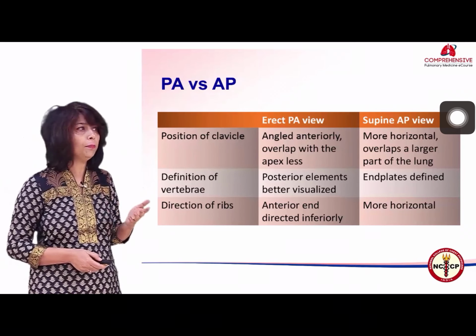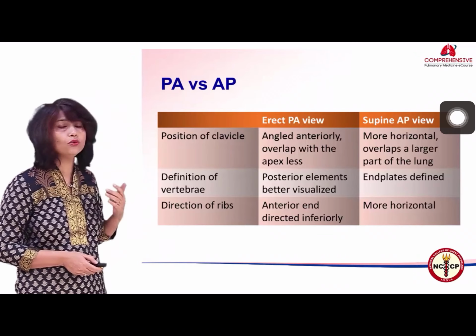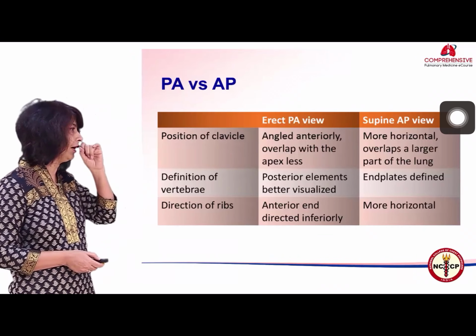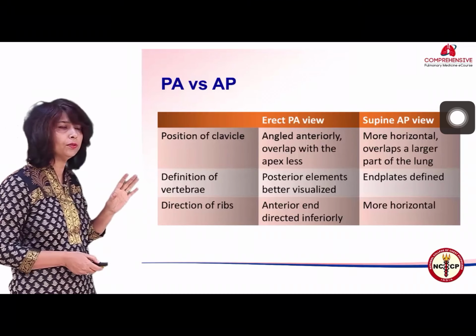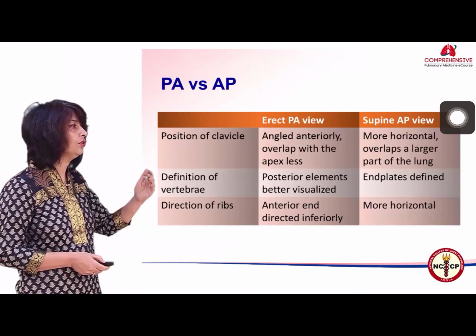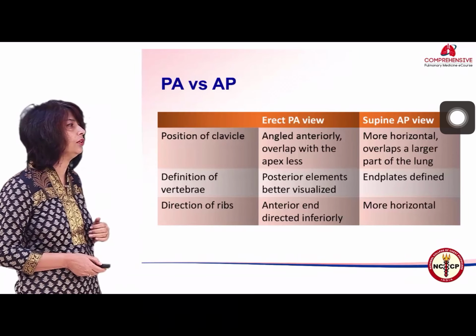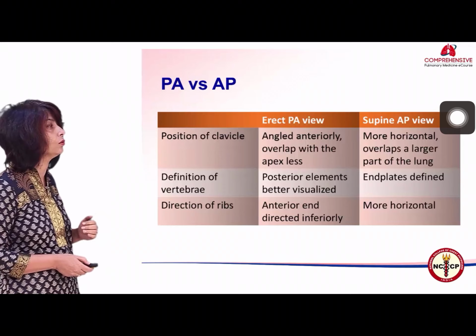Also, when you're interpreting pleural effusion or pneumothorax, you do want to know whether the radiograph has been taken in a standing position or a lying down AP position. So these are some of the differentiating points which we will see on the relevant radiographs also.